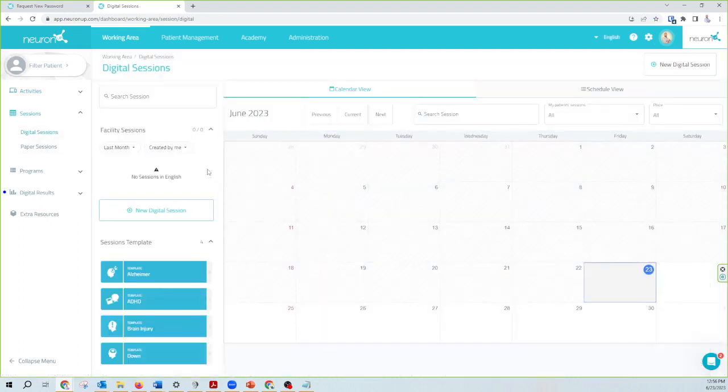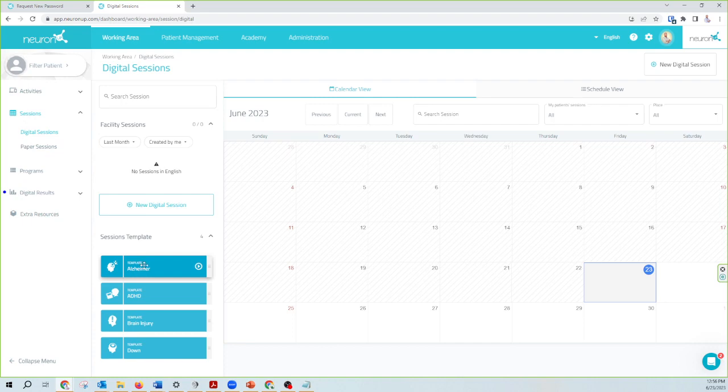And here on my session screen, you can see below we have four specific templated sessions that you can take advantage of. One for Alzheimer's, one for ADHD, one for brain injury, and another for Down syndrome.